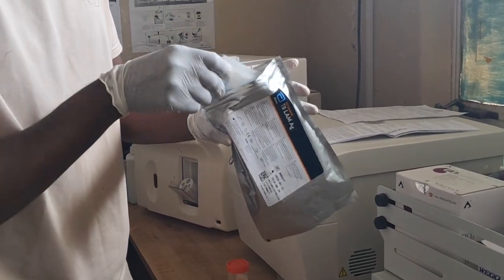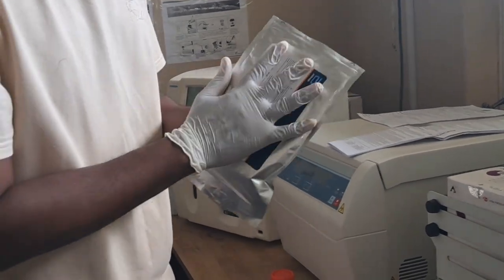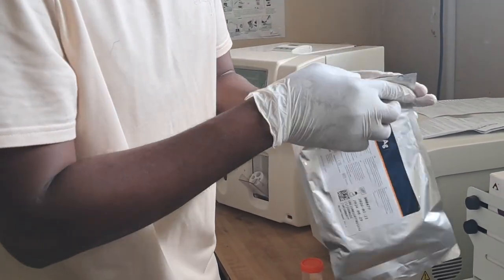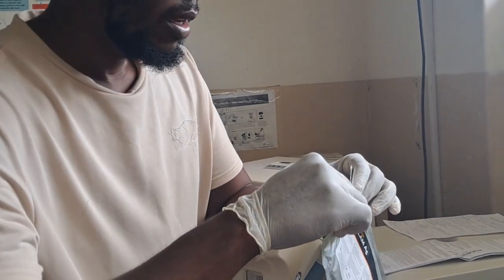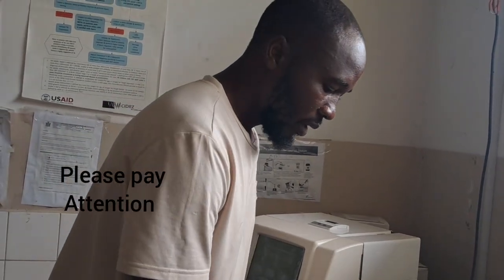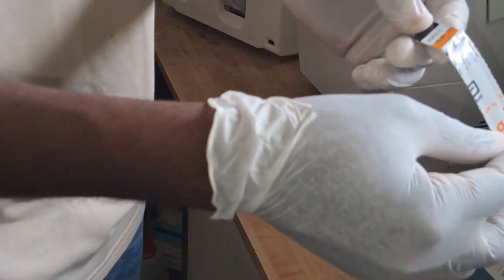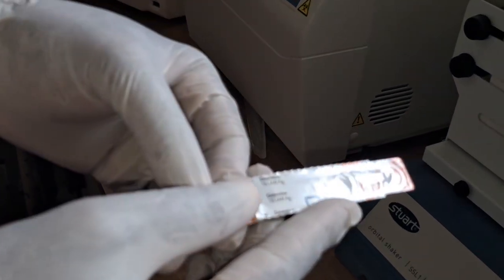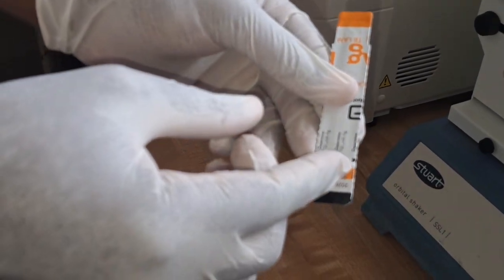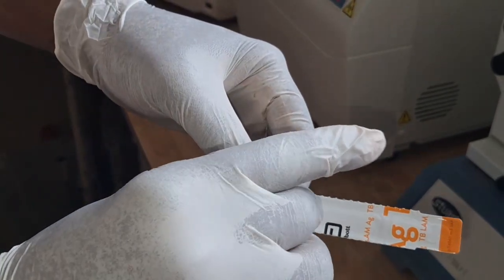The desiccant prevents moisture. Then squeeze the air out, then tighten properly. Then those ones are now safe to be used for another day. Then once you get the strip, this is the strip. Here is where we open it from. Have you seen? Here is where we open it from.